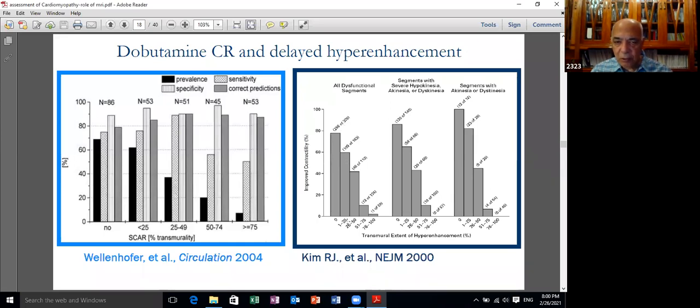Same applies to gadolinium delayed enhancement taking 1 to 25% of the myocardial thickness. But look, if you exceed 50%, there is a very minor possibility that you get salvage of this myocardium by any method of revascularization, whether we are talking about PCI or surgical revascularization.